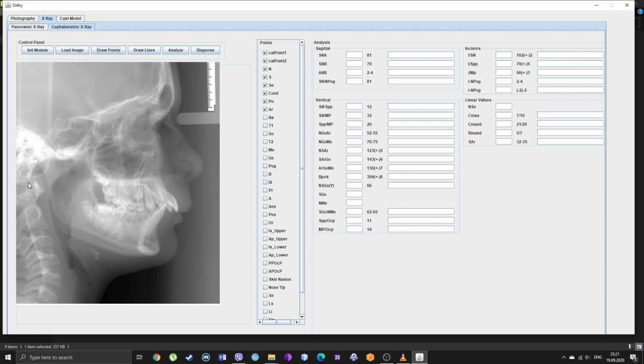Articulare, let's say it's here, I think. Yes, it should be here. Now T1, T1, T2 here. Okay, let's try this here. Let's go with this side. Bear with me here, this is just presentation.